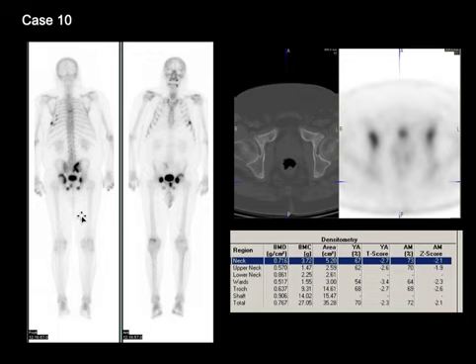So because of that, this patient was referred for an FDG PET CT scan, and the two images on the right are from the FDG PET CT scan showing focal hypermetabolism, but the CT part shows sclerosis and a healing fracture here in the right superior pubic ramus and also in the left superior pubic ramus.